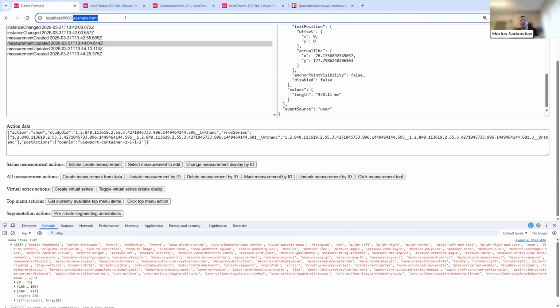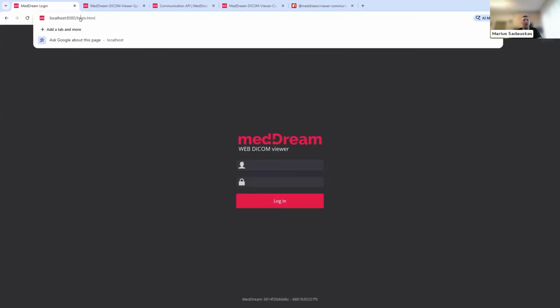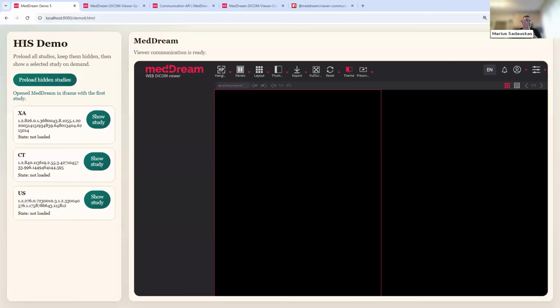And now I would like to go to a few more demos, which for now are not in the documentation, but we are thinking maybe for the next releases we will have them added as well. So now let's go to one demo. And imagine that this is your hospital information system.